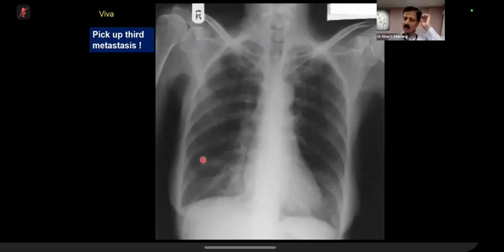Okay, I'll stop you because of the time factor. Please remember, these are the classical observational films. And in these types of film, if right now I am rushing you, don't worry because of the time factor. Otherwise, I would have given you the time to go through it. You go through your protocol, examiner has told you spine, so you start describing it in detail.